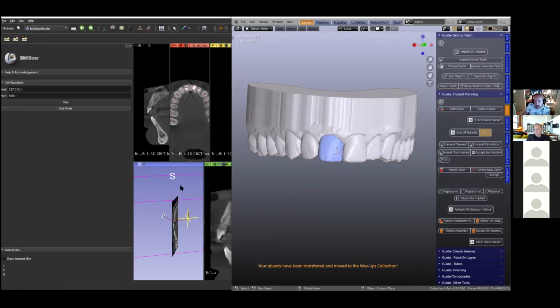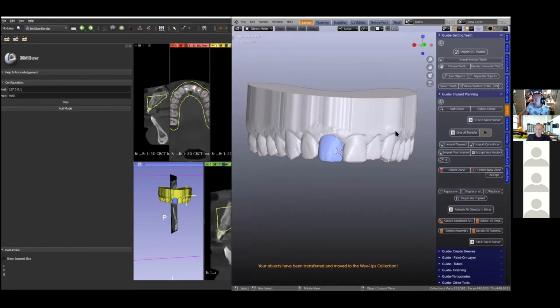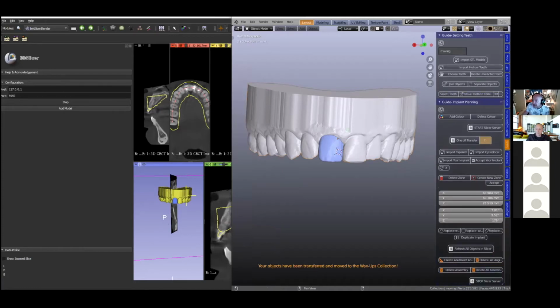So it's waiting. Here we go. Now usually I make it a different color, so I forgot this. Let us do that because we want to work with transparent models. So in order to select this again, I have to check this box.